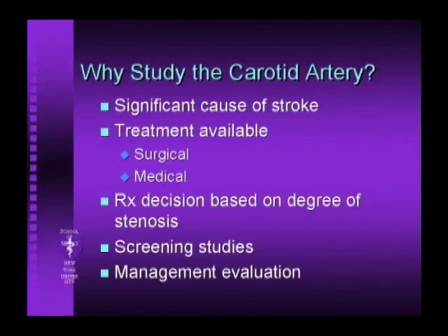So what I'd like to do over the next 30, 35 minutes or so is review the state of the art, if you will, where we are with imaging of the extracranial carotids. I'm not going to talk about the intracranial vessels because it's almost a separate discussion, but we're going to focus on extracranial. Quite frankly, I'll do a little bit more on the MRA than the CTA because we tend to do more of it at NYU.